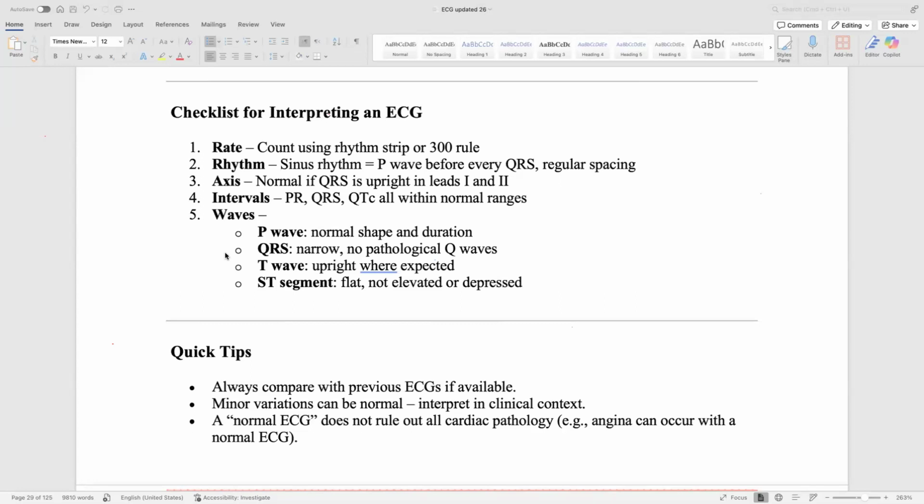Here is the same. If I have ST segment elevation in V5 and 6, that means this is a lateral area, the lateral part of the heart, maybe the apex or the lateral wall. So this is lateral. I will know this is from the circumflex artery. So we can easily concentrate when we take the patient to the PCI, easily concentrate on that area.